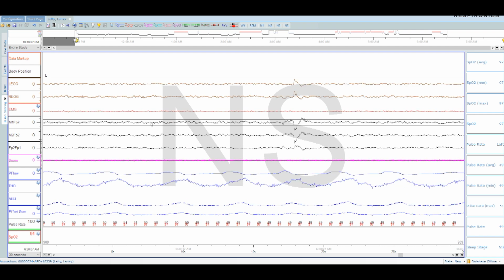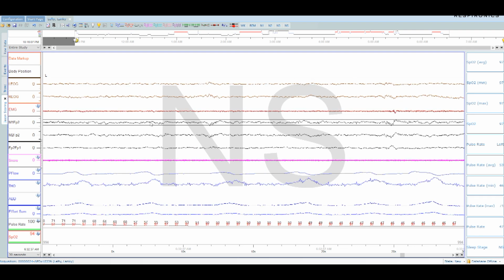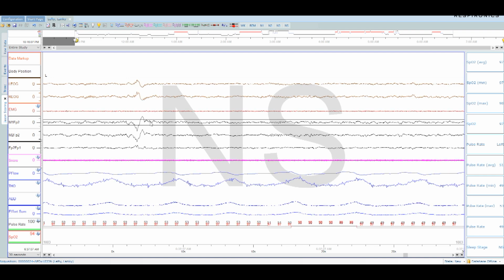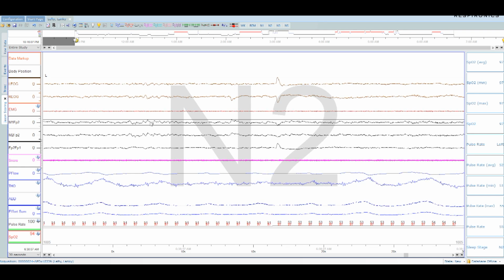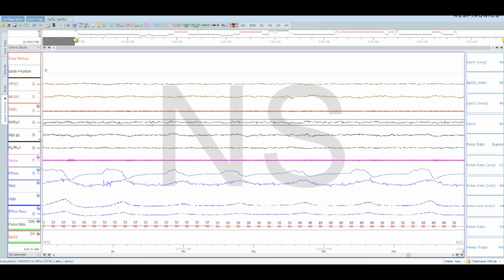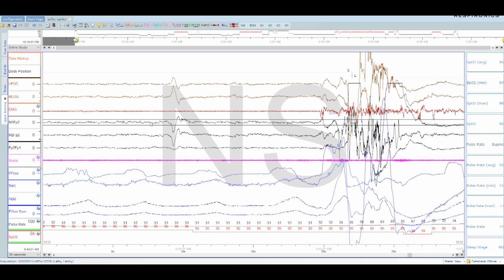So this is full transparency. This is how I score. This is a scoring method for sleep staging. If this kind of garbage is of interest to you, I'm really glad, because I can guarantee you this video is going to get practically no views.